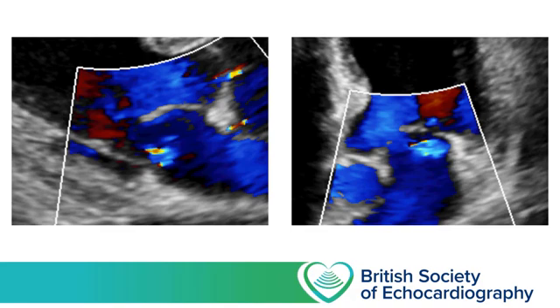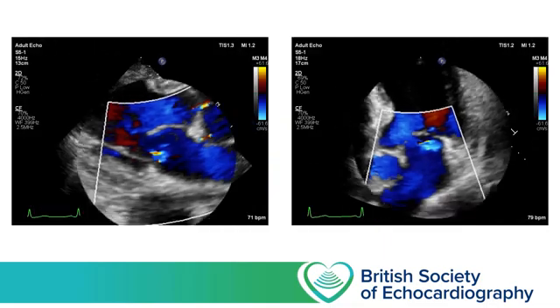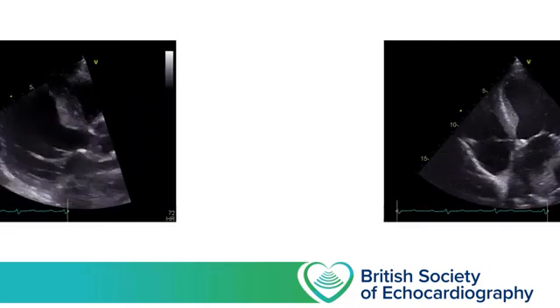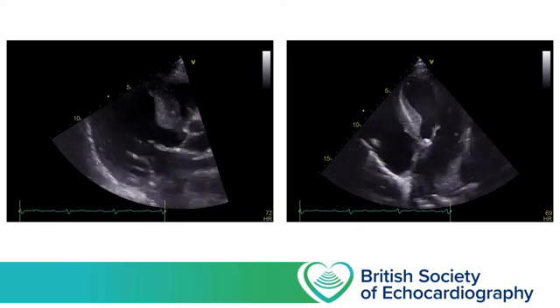But seeing as it's common, and you will see examples of it in your real life practice, I feel it makes sense to show a couple of examples here. So if these are both examples of insignificant mitral regurg, let's have a look at some examples of significant MR.